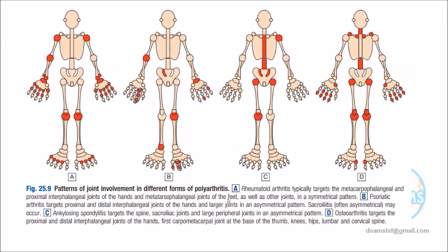Now this is the picture A. Dr. Heen, can you read it for us for better understanding? And everybody be attentive to A, B, C, D. Please, Dr. Heen.